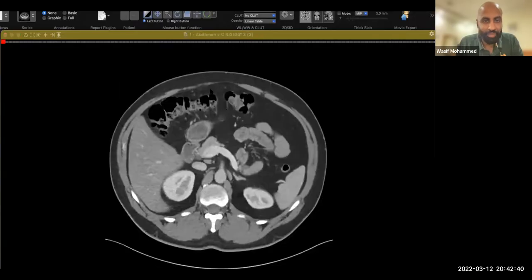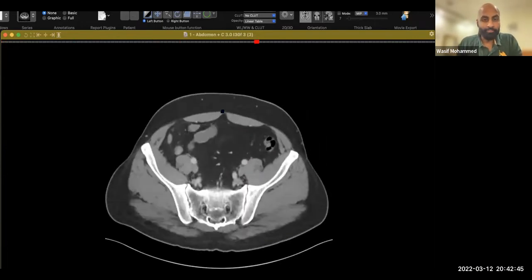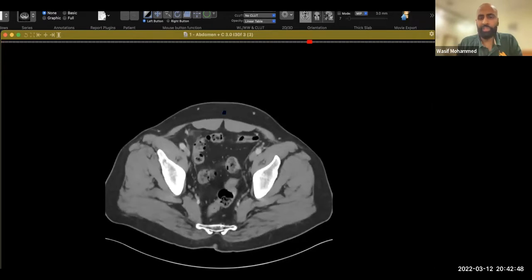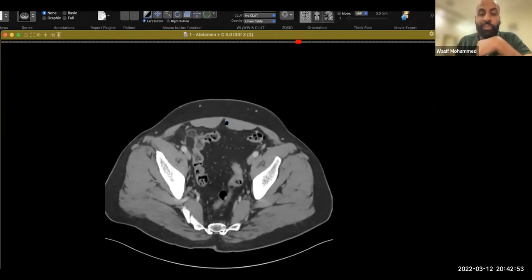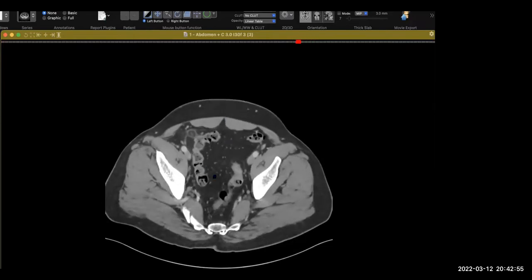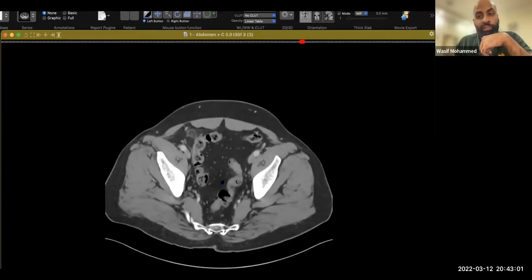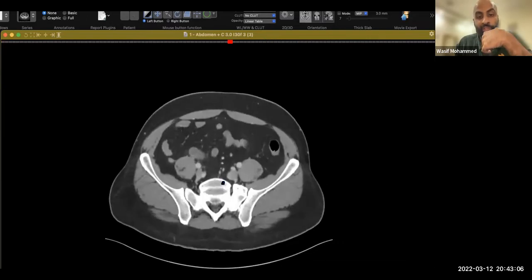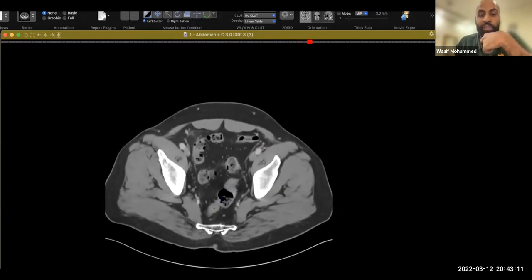So again, screen share. All right. So the first case, perfect. It might look like a case which is too simple for the 2B exam, but even diverticulitis came in the exam. So the first differential for this would be diverticulitis. The next consideration, in case the presenting history given to you by the examiner was right iliac fossa pain, would be appendicitis. But if you're seeing just that, then appendicitis would not be in the differential.